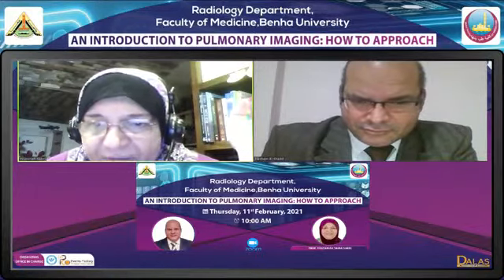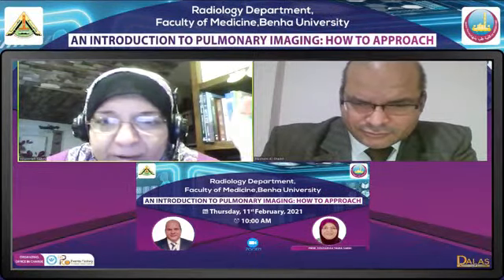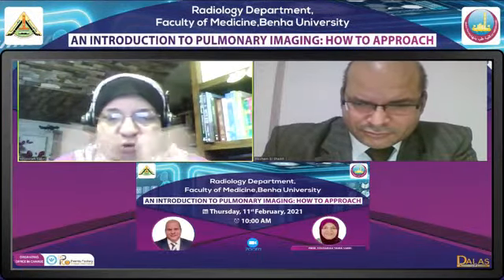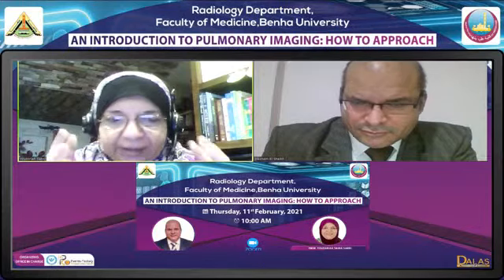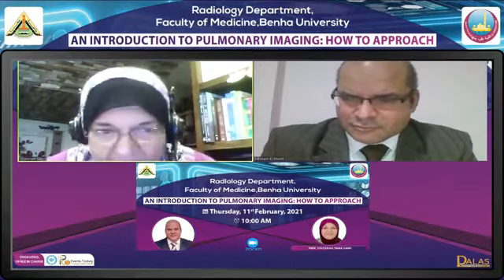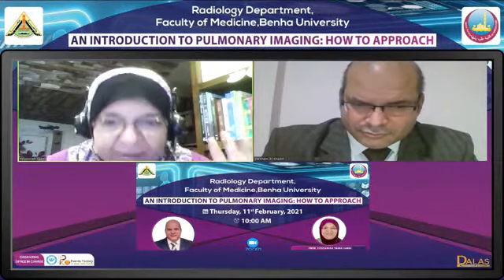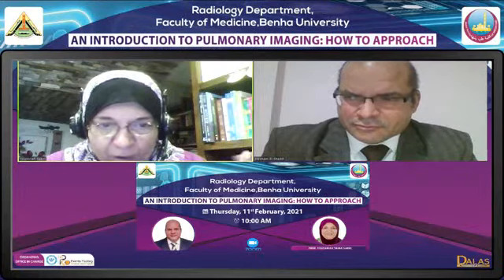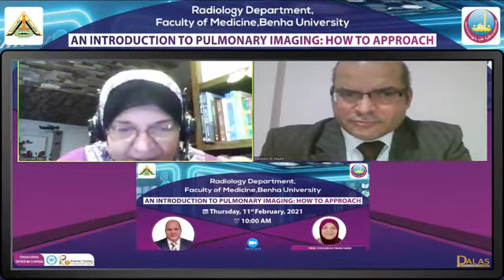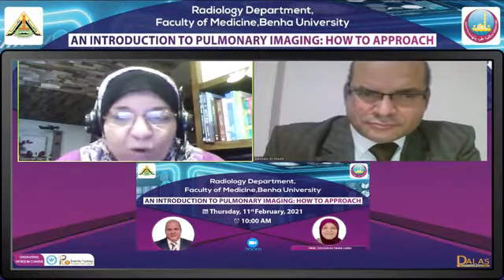طيب اول عشان لقيناها في السكه بس اهو. ده الهاني كومبينج. ايه اللي بشوفه في الهاني كومبينج؟ لازم ألاقي الشروط الآتية عشان اقول ده هاني كومبينج: ان انا ما بشوفش سيست، بشوف كلاسترز اوف سيست مكانها سب بلورال وبيزل بريدومينانت وفيلينج ذا بلورال ريسيس. يعني شكلها عامل ازاي؟ كلاسترز اوف سيستس تمام جنب بعض، مفيش حد فيهم يقدر يقول دي الوول بتاعتي.